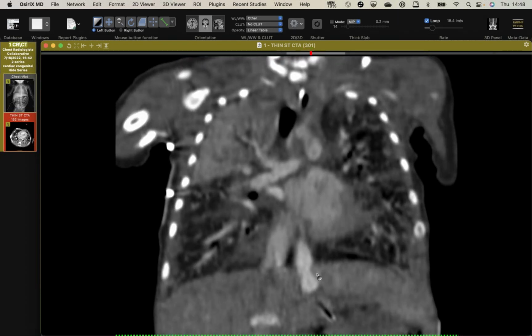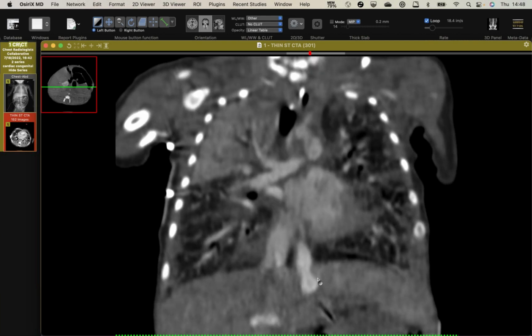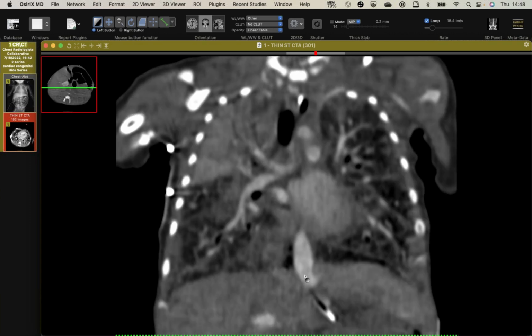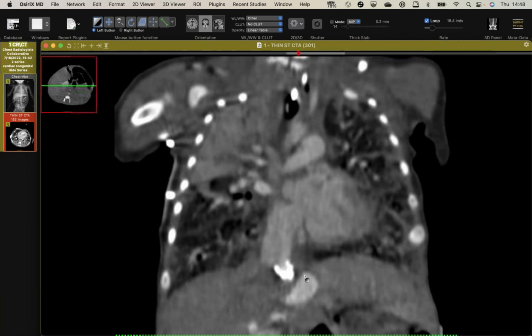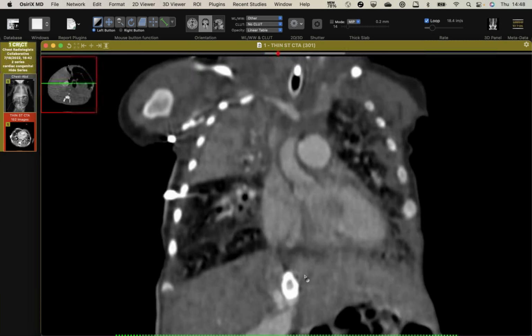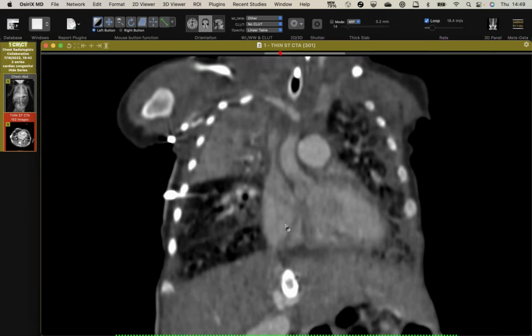Yeah. And it's important, as I learned from my colleague today, that these narrowings determine what they're going to do, and because it's pretty tight distally, they're going to repair this surgically. So, Jeff, what did his left atrium look like?